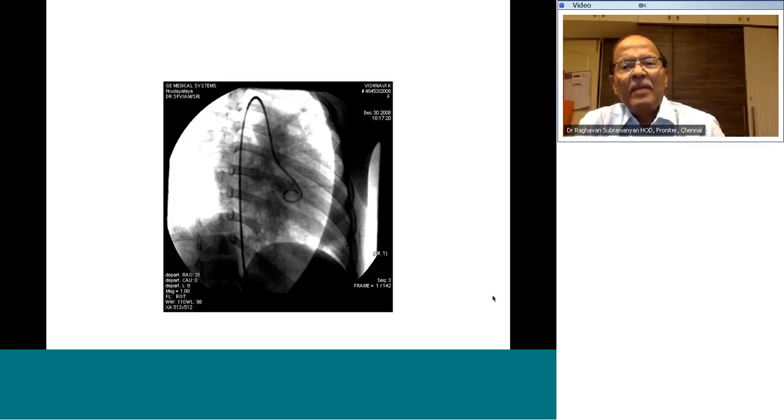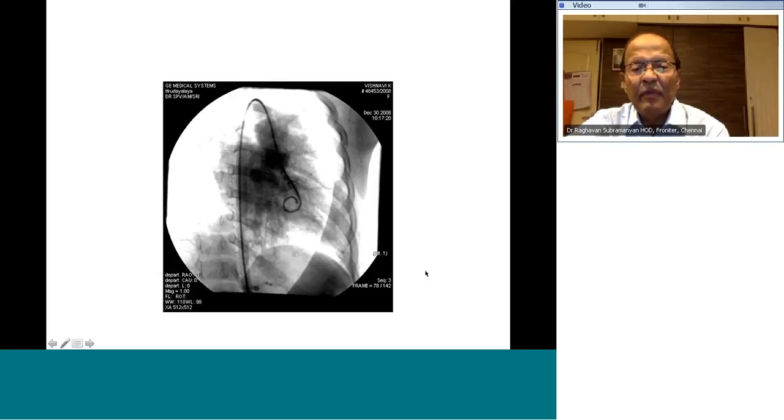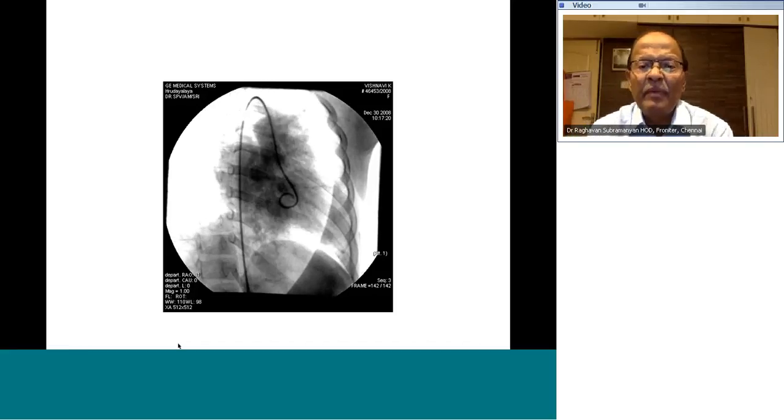Okay? If there are no questions on that, I go to this angiogram. Now, this is an angiogram which you have to interpret for me. And I told you how to interpret an angiogram. I'll run this angio. Again, I borrowed this angio from somebody else. Okay. Can somebody interpret this angio for me? It will keep running in loop. And I'll stop it for you if you want.